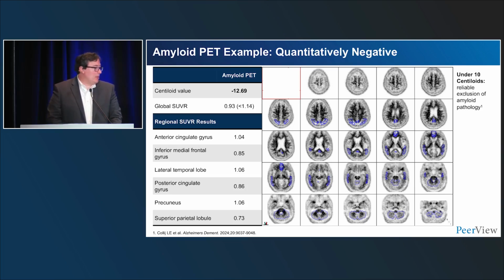And so by looking at the individual SUVRs, particularly in the precuneus and posterior cingulate, you may see abnormal SUVR even though the global Centiloid is negative. The other point to point out is, certainly with this method, there's a large amount of cortex that is not included in these ROIs. And so that's another potential way you could have a discrepancy between your visual interpretation and the quantitation.